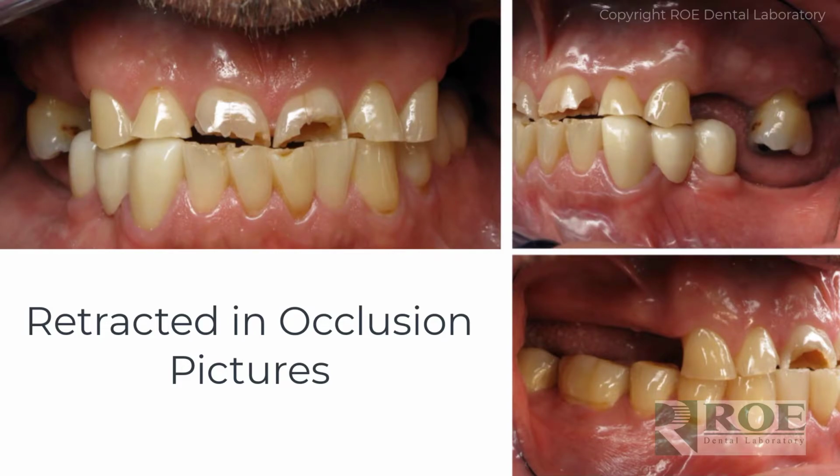And then these photographs are really nice too. And just some further analysis of these pictures, the doctor has the f-stop set pretty high, which is nice, probably an f20 or higher. And what that means is that we can see the surface of the teeth very nicely on the anterior and the posterior, so we have a nice depth of field. So a nicer high f-stop is what does that. Every camera is a little different, but as far as depth of field, f-stop is the way to go.